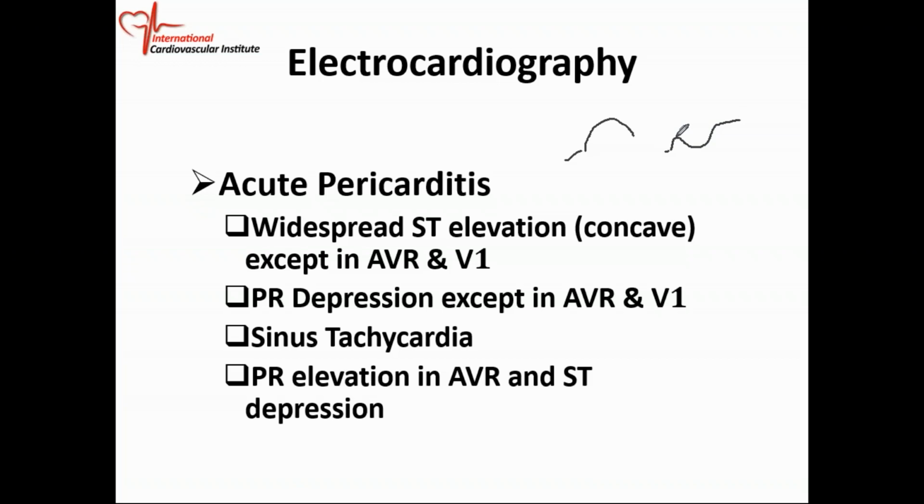It dips in, whereas with your heart attack they talk about the tombstone, so it bulges out. Again, widespread ST elevation in all your leads except AVR and V1.